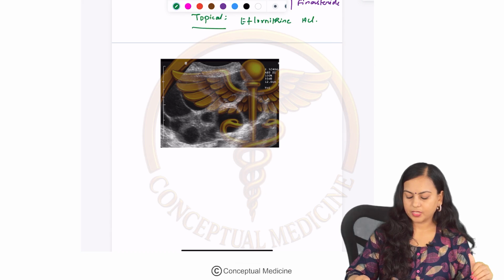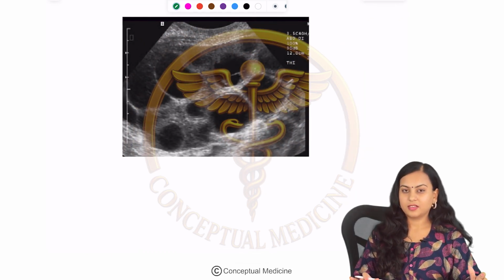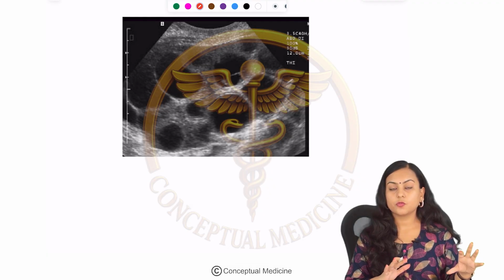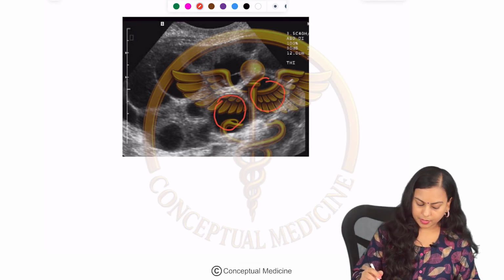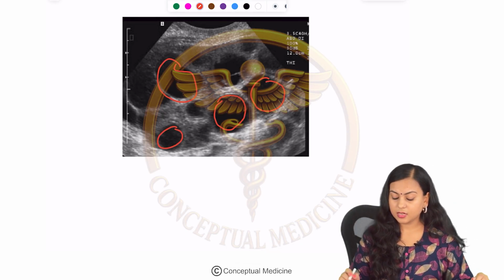Now, yeah. Now, seeing this picture, don't tell me this is PCOS, okay. So, the difference between PCOS and this picture is that here you are able to see many big cysts, right, many big cysts, and they are of varying sizes also, right.